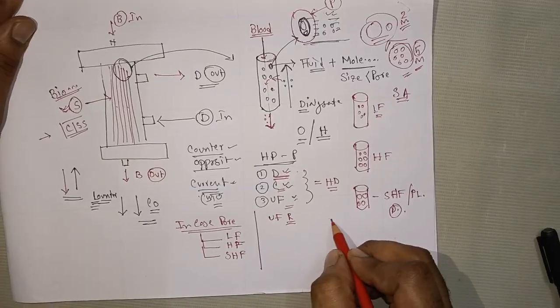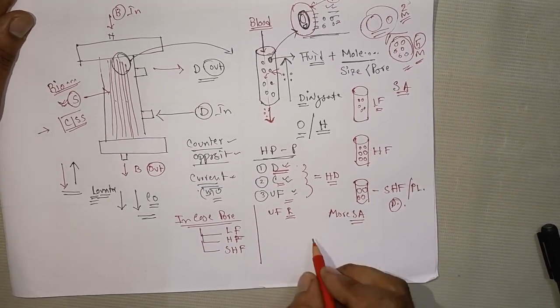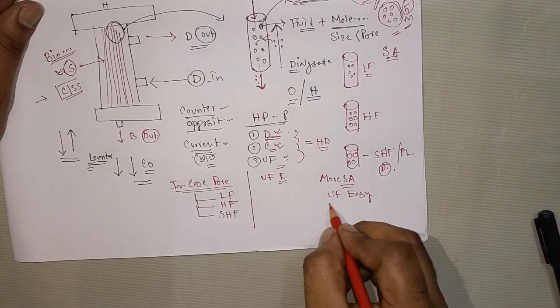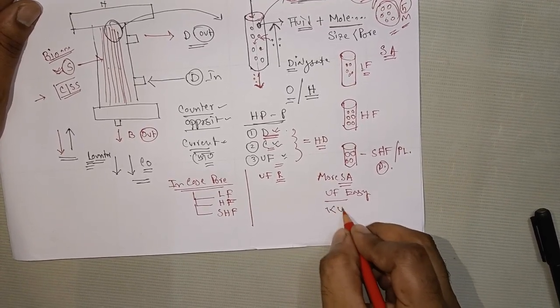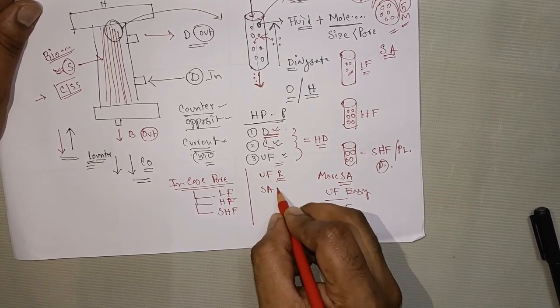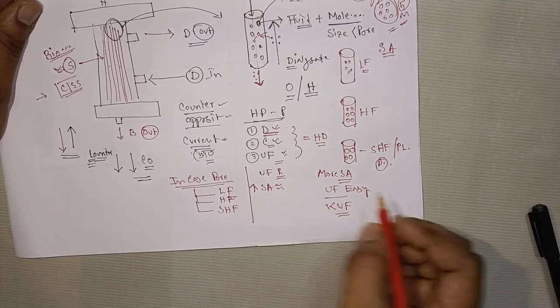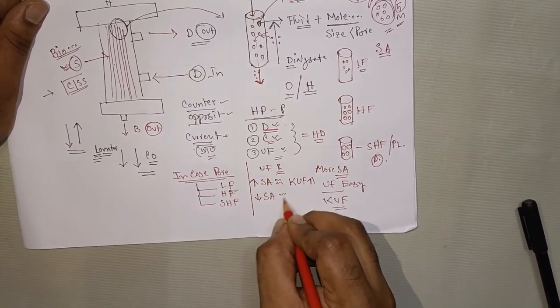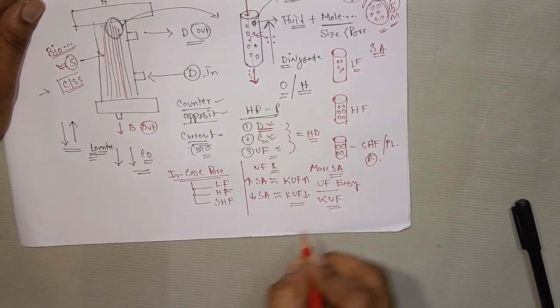So if a dialyzer has more surface area, then UF removal is much easier. That is called the ultrafiltration coefficient, KUF. So if surface area is high, then the KUF will be high. If it is a low surface area dialyzer, KUF is generally going to be low.